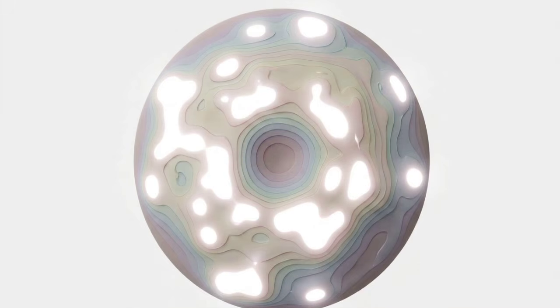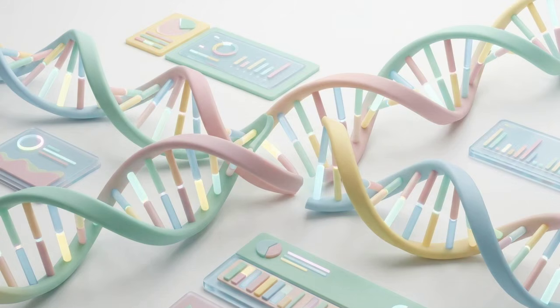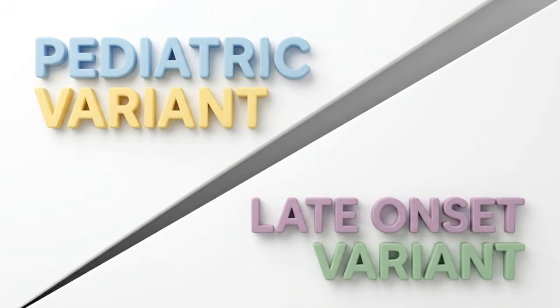This image is a fundus autofluorescence, or AF scan. It is the mandatory investigative tool for identifying these inherited retinal diseases. AF works by mapping metabolic stress. The intensely bright patches you see indicate increased background hyperautofluorescence, which signals a widespread genetic RPE dysfunction rather than localized aging. 2 prominent examples are Best's disease and adult vitelliform dystrophy, or AVD.